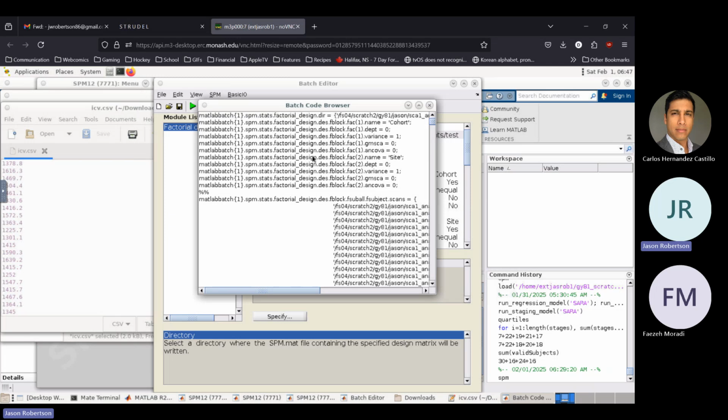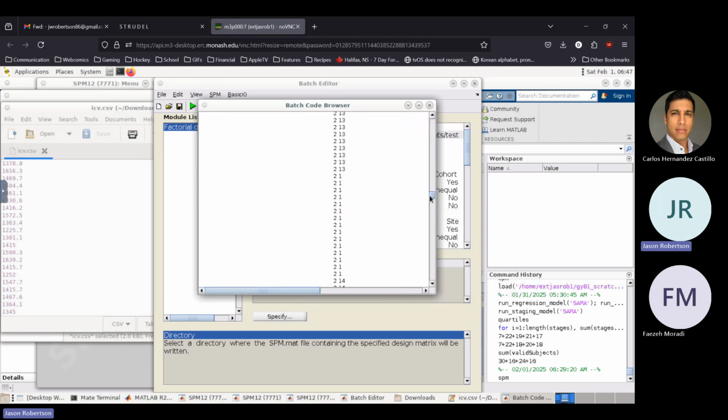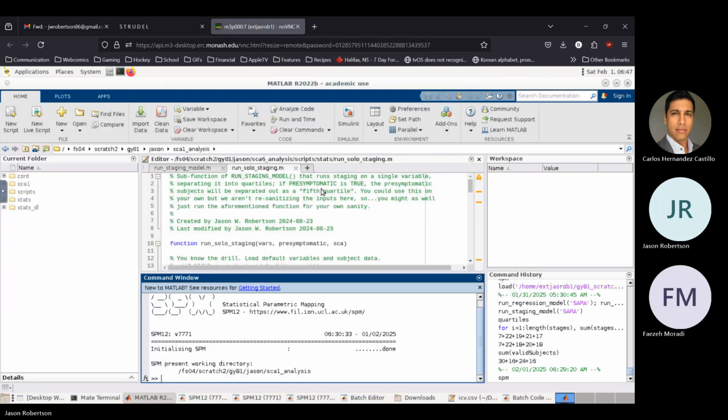And you can basically copy this code directly. And obviously right now it's got the names of all my files and all the actual raw numbers in there, hard coded. But you can replace those with variable names. And I'll show you that in a little bit. Actually, no, you know what? I'm going to show you now.